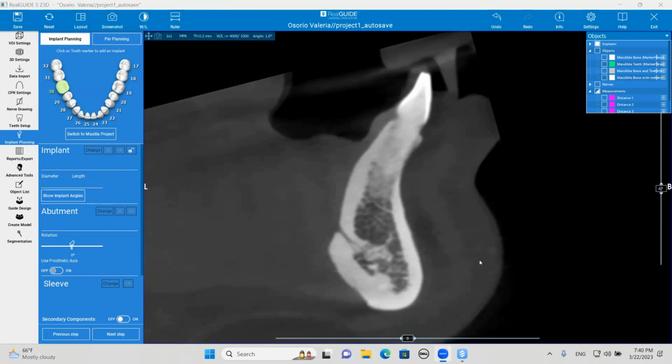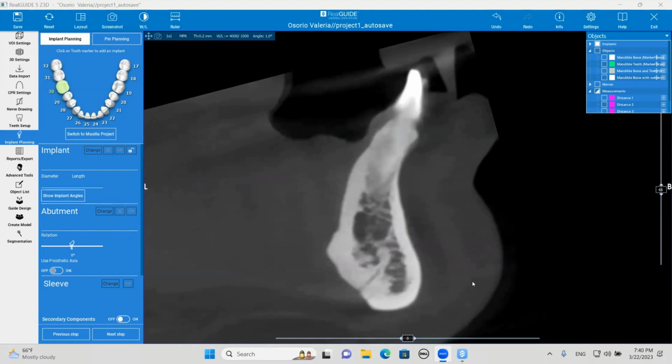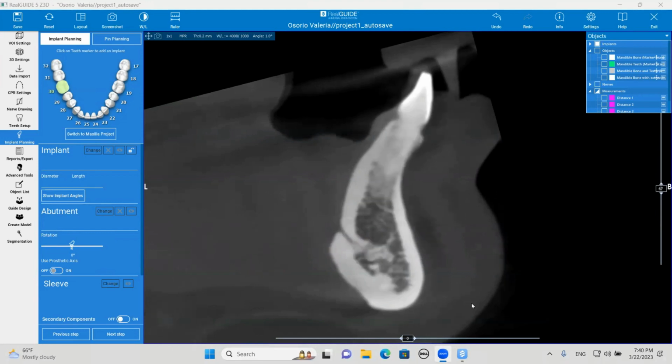So if you scroll through here, go each way 1 or 2 clicks. Keep going, keep going, keep going. Ooh, that comes through, go back. Okay, that comes through more apical. This is a really neat one. So, okay, go back to our first opening, which is the origin of it. If you look at that little radiolucency, show them that with a pointer. Okay, sorry. Yeah, that's all right. Just show them with the cursor.